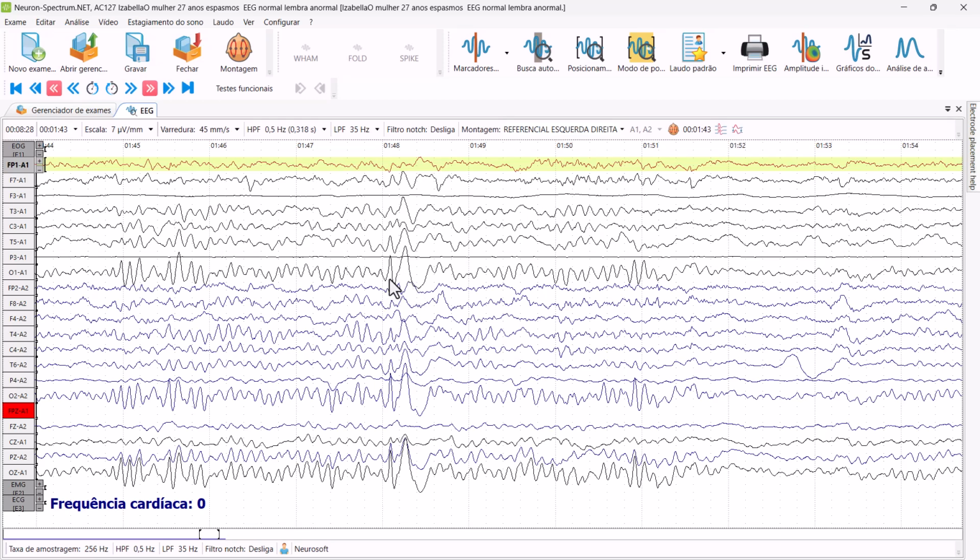This type of wave is sleep activity, an alpha activity that captured a little more power resulting from the sleep activity. But it's the same rhythm that you are seeing here. See? After this fake spike wave, what happens? We have a return of the normal base activity right after. As soon as this sleep activity ends, we return to the normal base activity. You don't have any disruption of background activity, right?